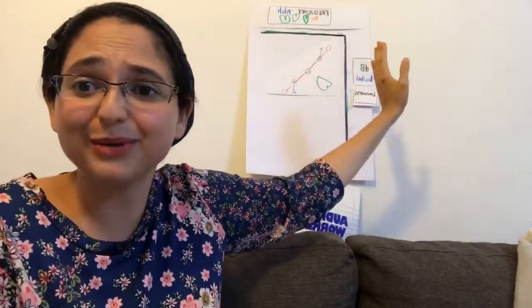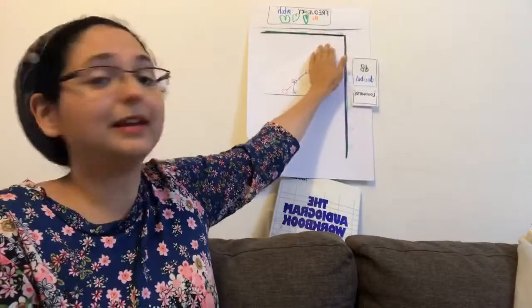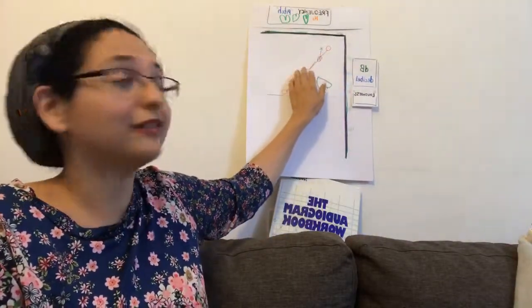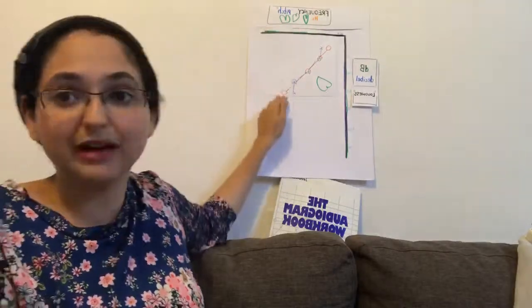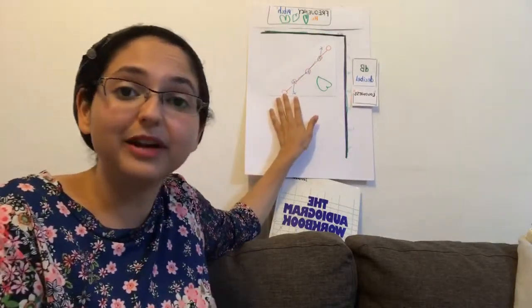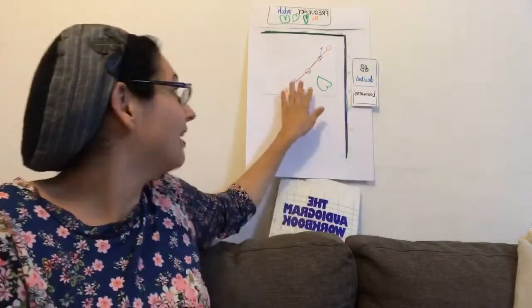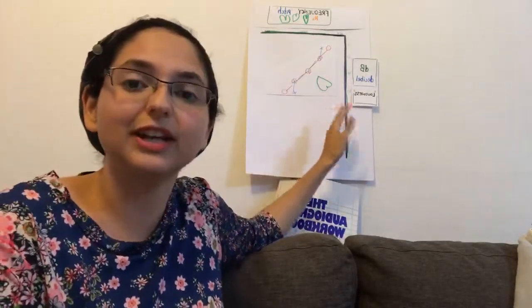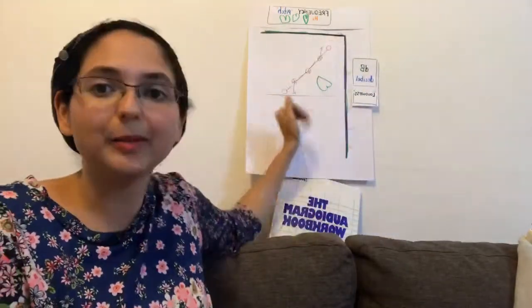I'm sorry that this is a mirror image, but it's to the left. The low frequencies are coming in normal, and then the mid frequencies have some hearing loss, and the high frequencies have the most amount of hearing loss. This is very common as we age, and older adults have this kind of hearing loss generally. High frequency, also called sloping, because it's like a slope.